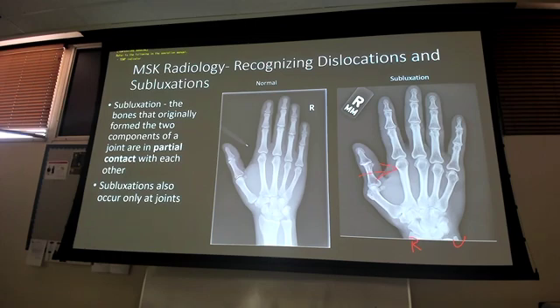Yeah, what else? So since you don't have the second picture, you can't really tell if it's dislocated. I can tell it's not dislocated because I still have connection here. But if it went backwards, kind of like the last picture, I can't tell if there's any change between dorsal and ventral movement, correct? Because I don't have that lateral, so I have no idea if it's shifting dorsally or ventrally. That is accurate. But with the information I have, this would be an ulnar subluxation.